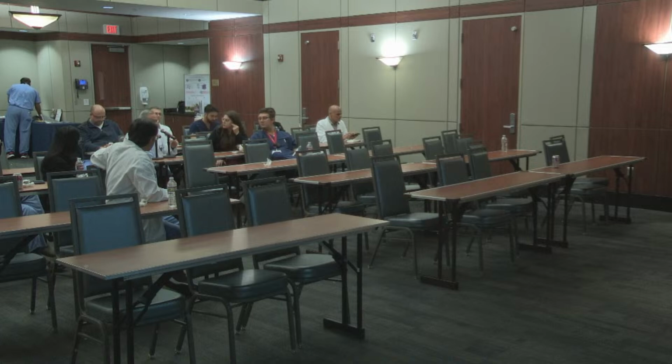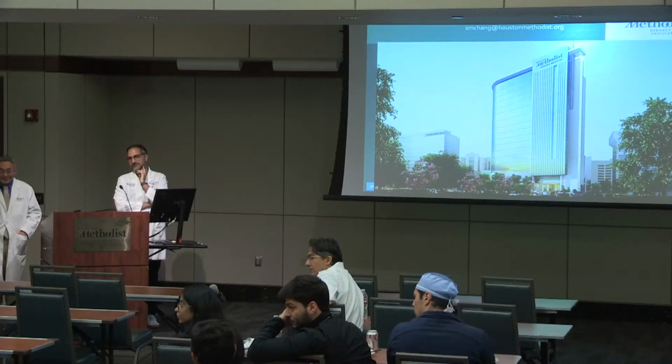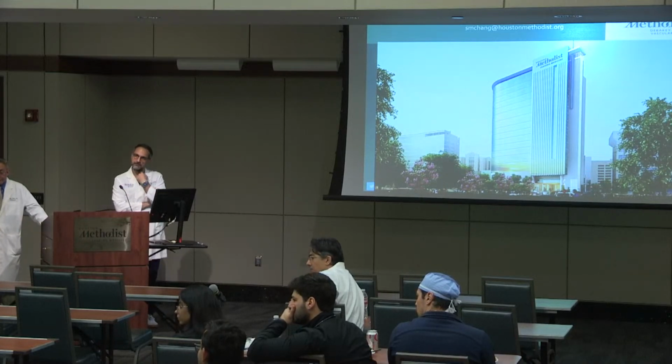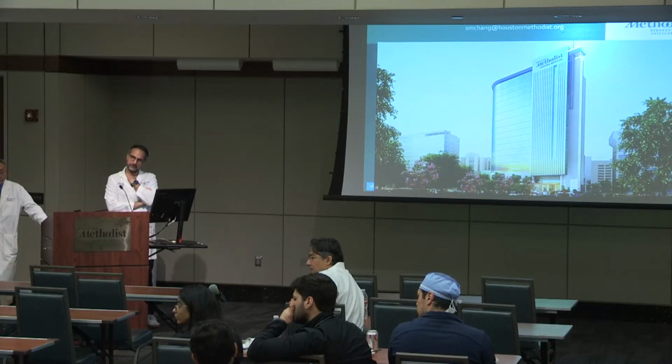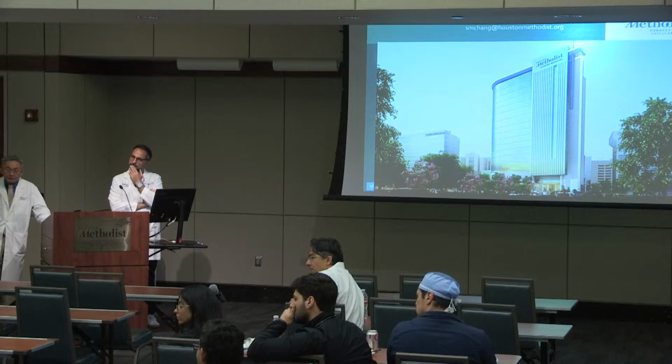That first case that you showed, Sumin, I think the CMR was worthless. I would have substituted the CMR with a stress echo because at 150, you had a gradient of 7, which is very high. That patient very easily on a bicycle would have gone to a gradient of 15 with exercise and the heart rate going up. And that would have given more important information to the clinician than what you got from the CMR.